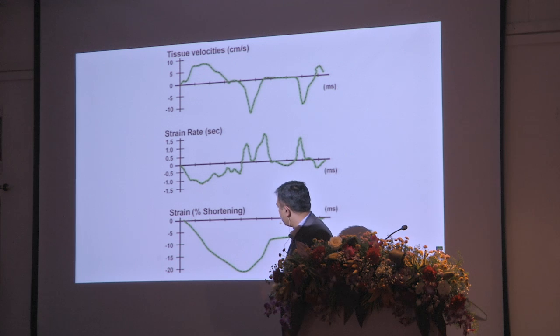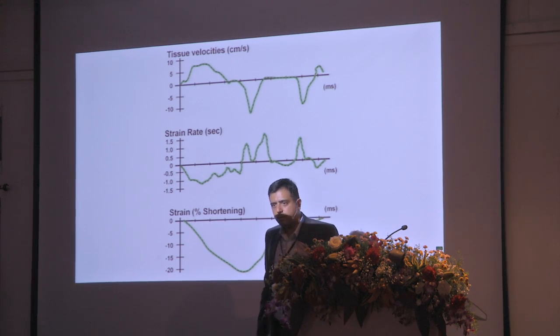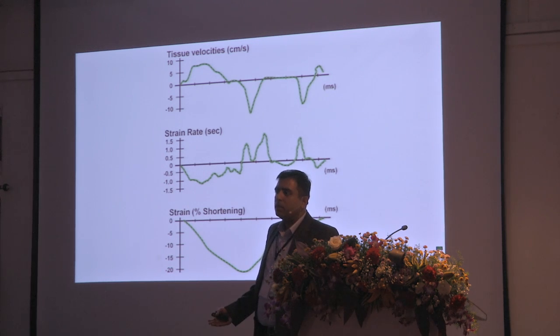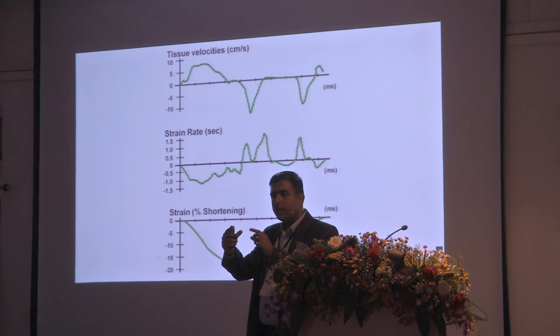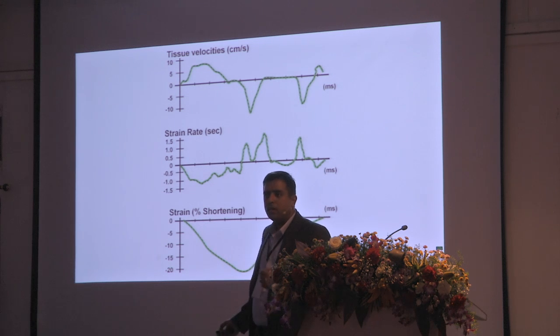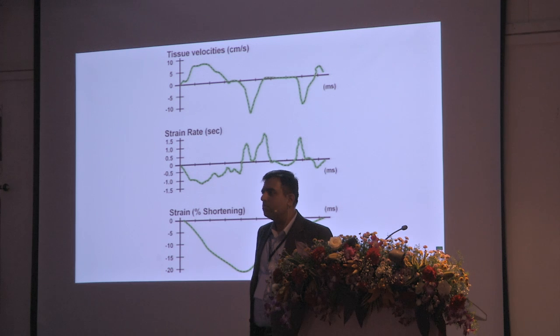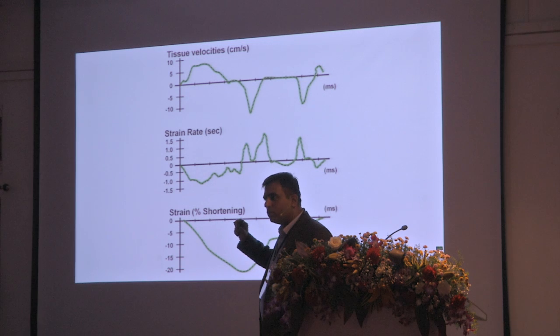Okay. Because this curve will tell us that, hey, the myocardium has deformed 20%. 18%, 15 to 18% is the normal deformation. It is shortened by 20%, and you know that is normal. So just like how you have ejection fraction say 55%, it won't be long in the future where somebody says, you know, this guy has a deformation of only minus 10%, so I think he is higher risk or something of that sort. So it is important for you to know this.